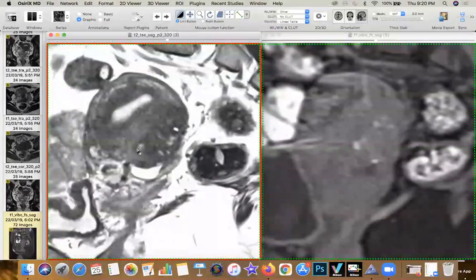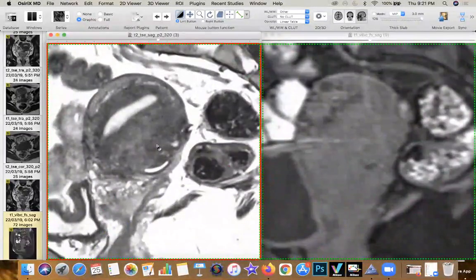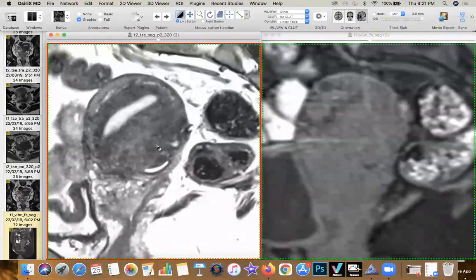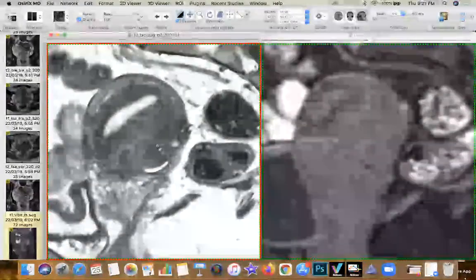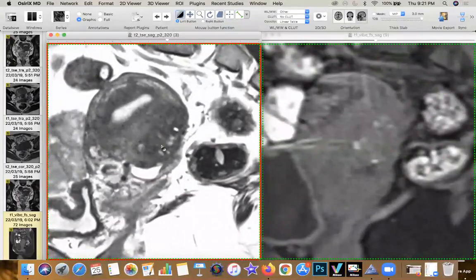And that endometriotic tissue is going to look exactly similar to adenomyotic tissue, which is where you have broadening of the junctional zone. So though this does fit into broadening of the junctional zone, it is not a true adenomyosis which you're seeing. This is pseudoadenomyosis, or what I call subserosal posterior or anterior myometrial infiltration of the endometriotic tissue.